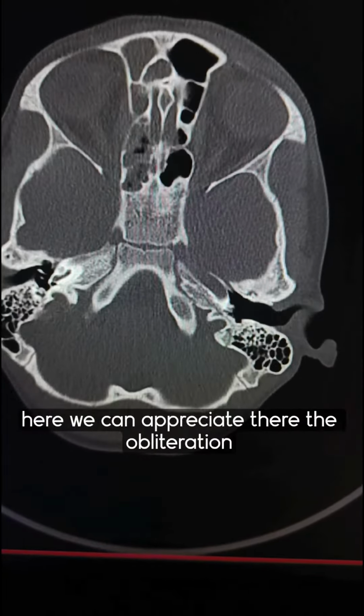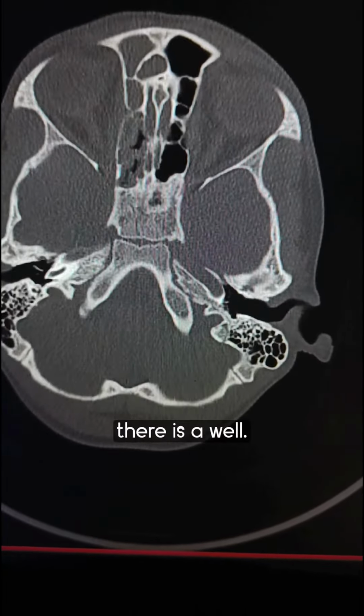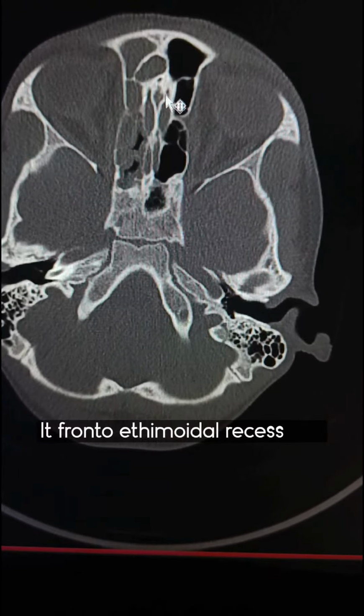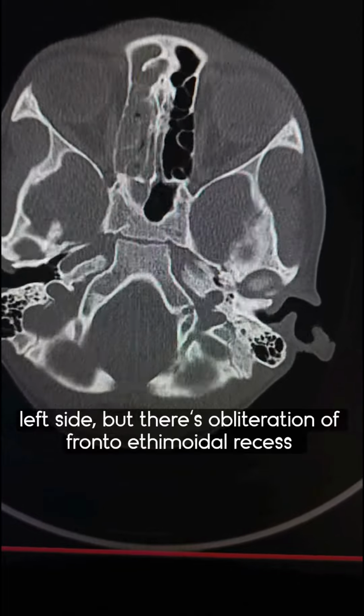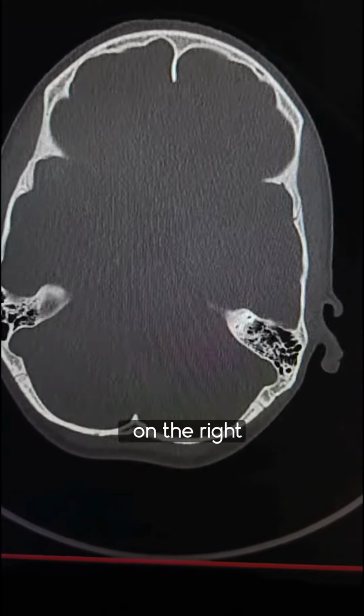Also here we can appreciate the obliteration. There is a well-formed frontoethmoidal recess on the left side, but there is obliteration of the frontoethmoidal recess on the right side.